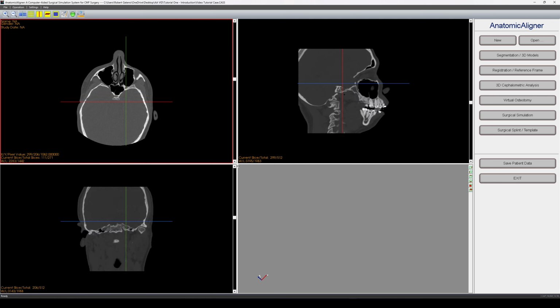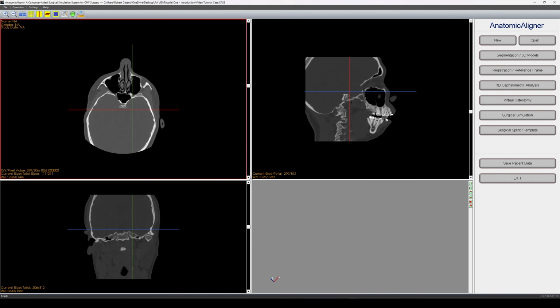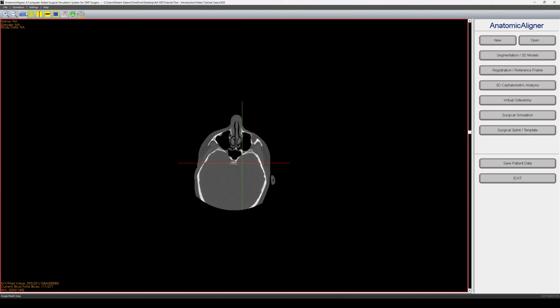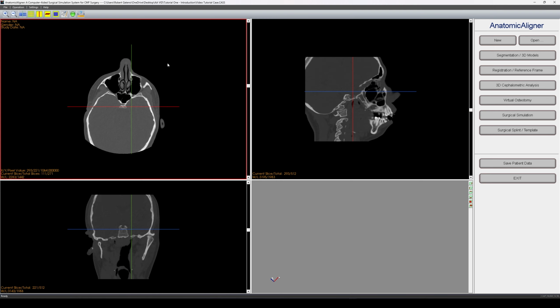We're able to customize our viewport layout by hovering over these medians, clicking and dragging, allowing us to scale our viewports to our desire. We can also enlarge a selected viewport, notated by the red bounding box, by clicking the Enlarge minimize icon in the top left.